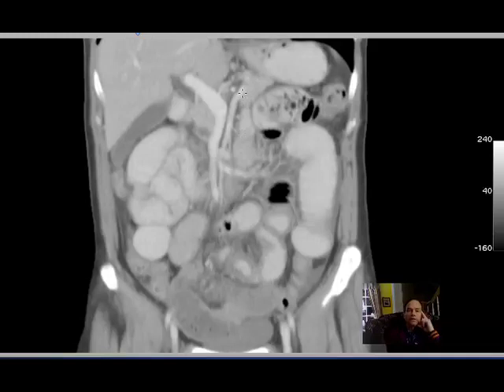And then here we have, what structure is this? This would be a nice one for me to use in an exam and say, well, okay, what's this? What's this? And what's that? Basic, important. I think you're hopefully comfortable with those things now. What do you see about this vessel that distinguishes it from this?